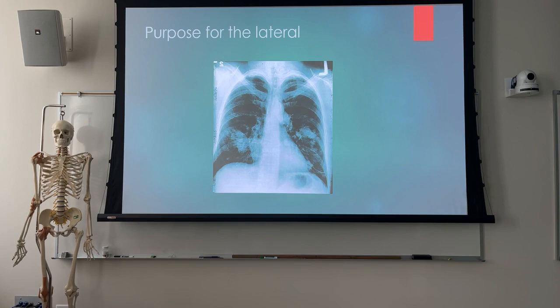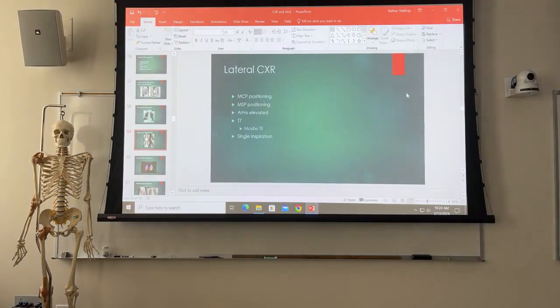Okay, so who says lower lobe? It's left lung, so it's only 2 lobes. Who says lower lobe? Okay, so about a third of the class. Who says upper lobe? Yeah. Fewer people, but still some people. So some disagreements there, right? So what we need to consider then is this.